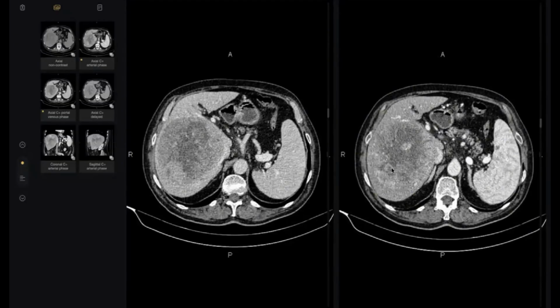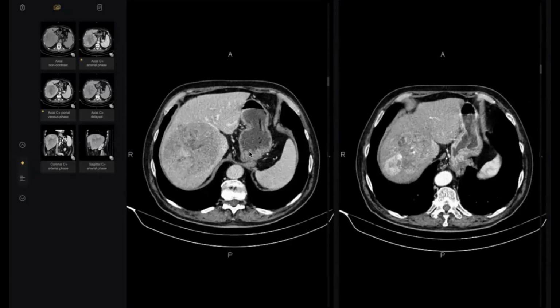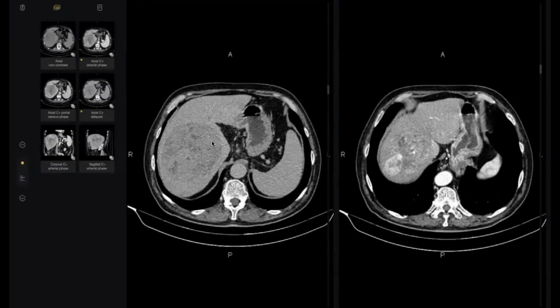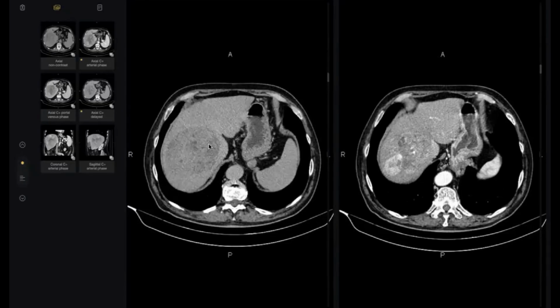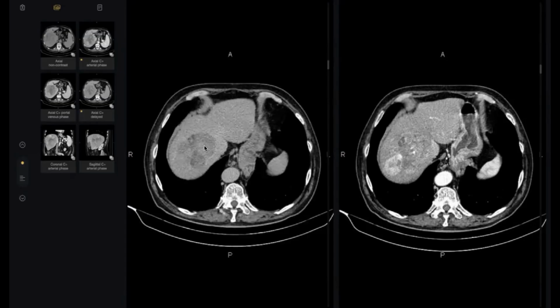This is the arterial phase. See these nodules. Look here, this is the nodule. Some show marked enhancement, some show heterogeneous post-contrast enhancement, while some of the lesions are non-enhanced. This is the hyper arterial enhancement. Could you detect any washout here?